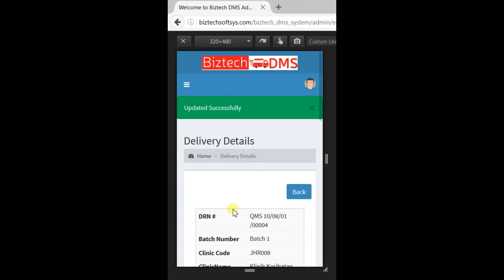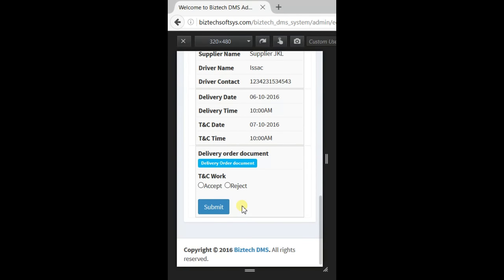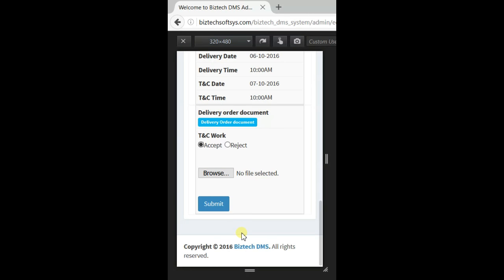So once he uploads the delivery order document, he needs to accept the TNC work, the testing and commissioning work. He needs to click accept, and if the testing and commissioning work is on the same day, he needs to complete that and he needs to upload that file also.